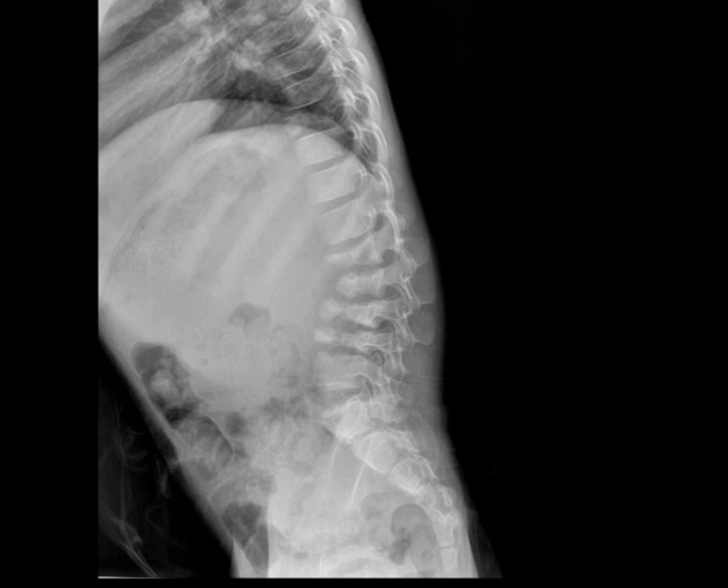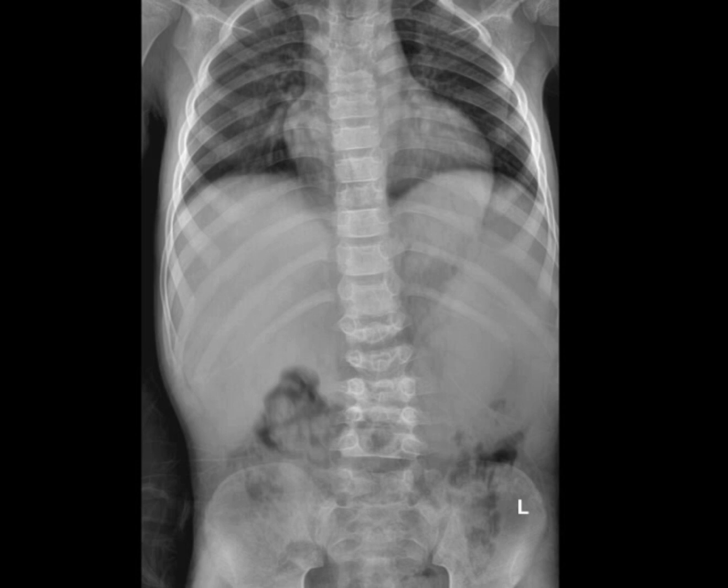Hemolytic process. Good. Like what? Sickle cell disease first, and others. What others? Thalassemia might cause it, and spherocytosis might even cause it. Basically all kinds of hemolytic anemia. So, MRI was ordered for this case to know the cause of his H-shaped vertebra.